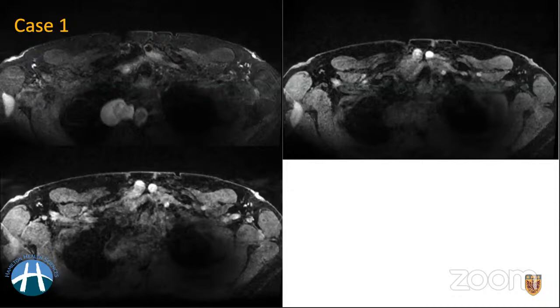I have put together some actual images of the thorax. This particular examination was performed for a screening breast MRI for a woman who is a part of a high-risk screening program. These women get annual screening MRI examinations as a part of our high-risk screening because they are predisposed to a higher risk of developing breast cancer. And this was the first baseline MRI examination. In this particular MRI examination, I'm going to describe the findings and then let you type your answers in the comment section.